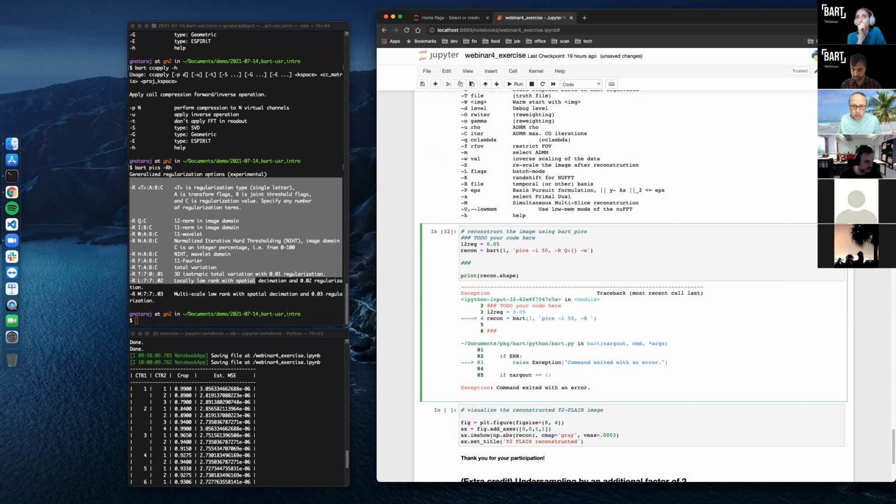Well, it's just dash W. And now we have 2 arguments to give it, right? So the first one being, we need to actually specify the scale factor as well. What would be the first argument? L2 reg.